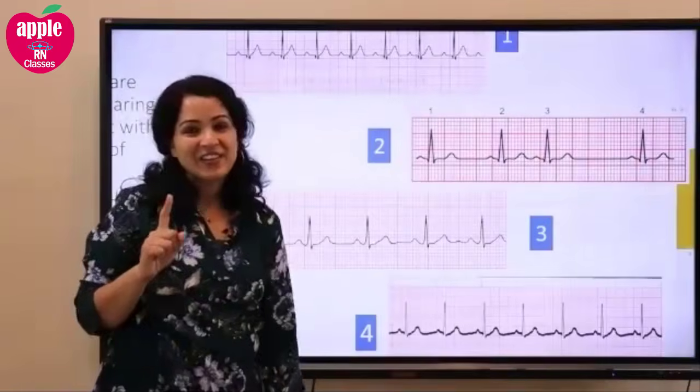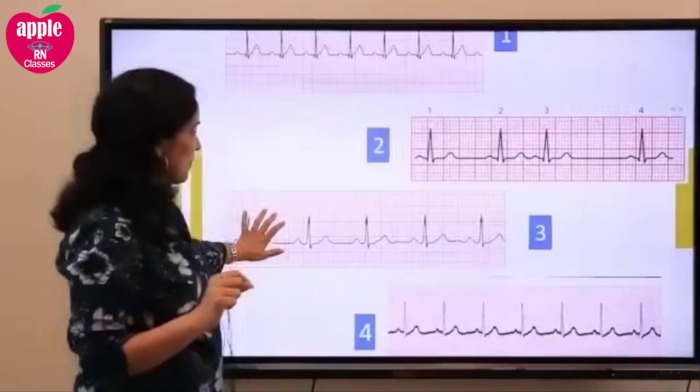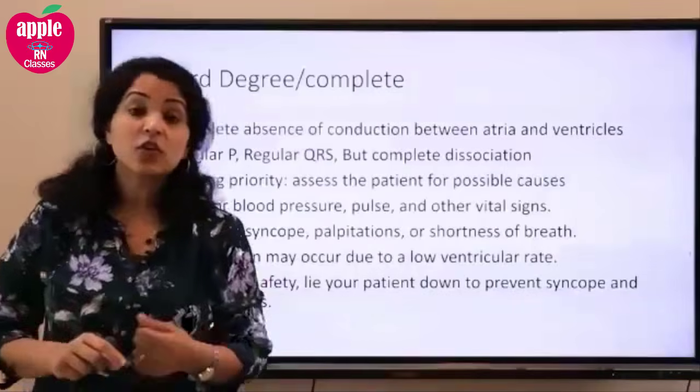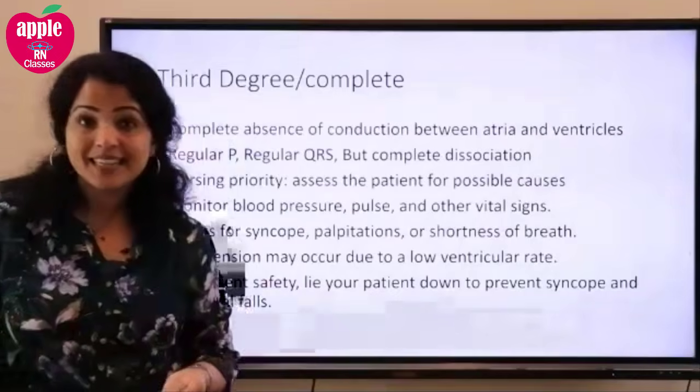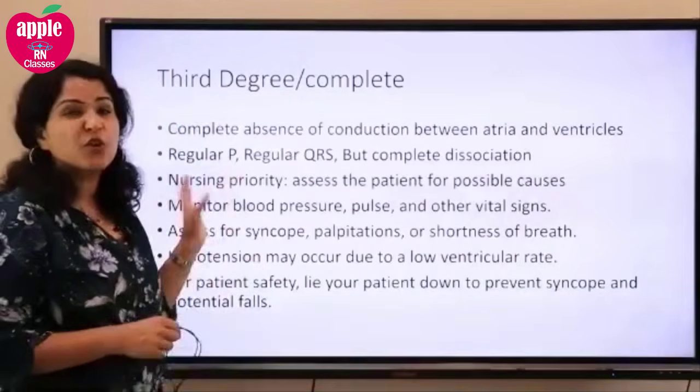Okay, now we are going to go into the third degree heart block. Okay, the third degree problem. Let me stop that. There we go. This is also called complete heart block. So sometimes they will say third degree, sometimes they will say complete. Either way, this is the huge issue.